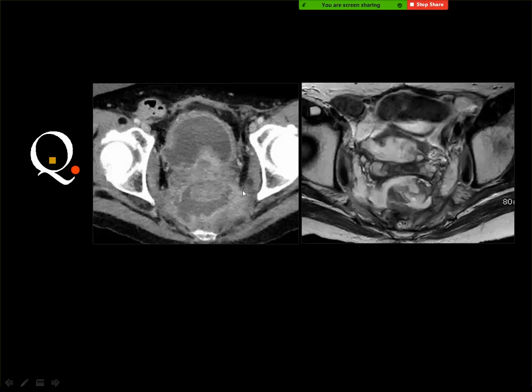Sarcoma invasive of the bladder. Let us say it is a malignant lesion, but is it in the rectum, or in the prostate, or in the bladder? I think it's in the prostate and invasive. Yes, you think the epicenter is in the prostatic area with invasion of both the bladder and the rectum.